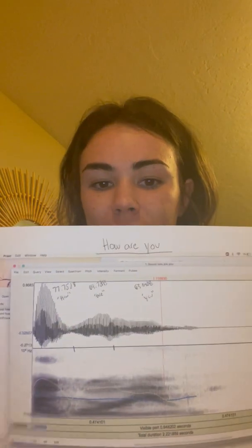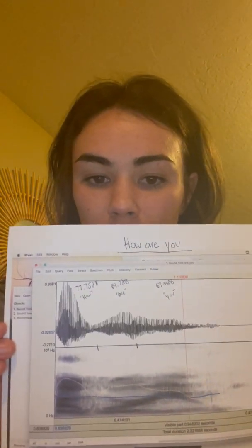Hi, my name's Sydney, and I'm going to be talking about how I measured phonatory variables today using a program called Praat. The phrase I tested today was the simple phrase, "How are you?"